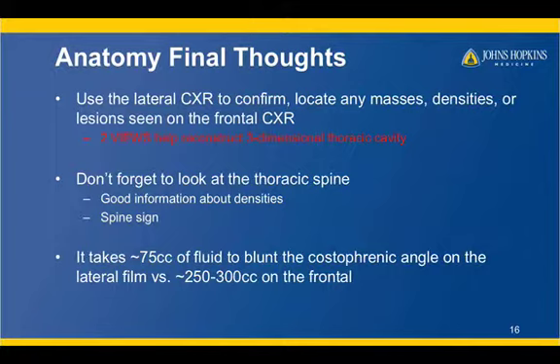Another important note is that it takes approximately 75 cc's or milliliters of fluid to blunt the costophrenic angle on the lateral film, versus approximately 250 to 300 cc's on the frontal film. This becomes important when you are looking for effusions on a chest X-ray.